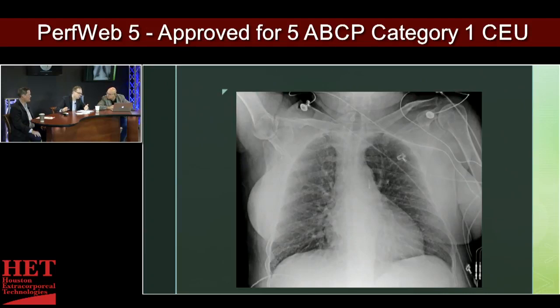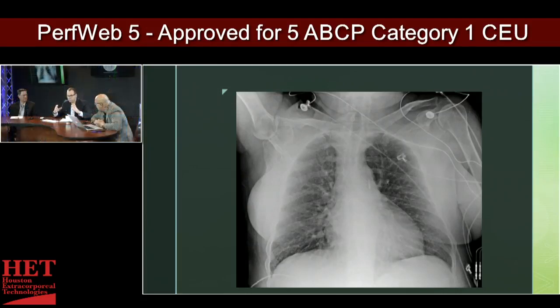of the film. Do you see the spinous process is straight up and down along the spine? Is the trachea lined up with that, or is it off to the side? Is the patient laying flat and the x-ray is exactly 90 degrees perpendicular to the patient? Or is the patient slightly sitting up in bed and the technique of the radiologist or the technician is such that the projector is not exactly perpendicular to the patient? And so that can skew the way that it looks.